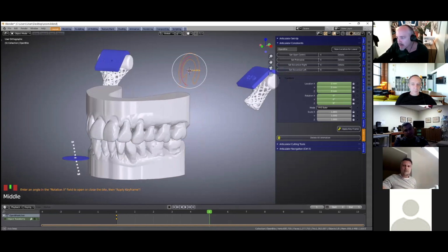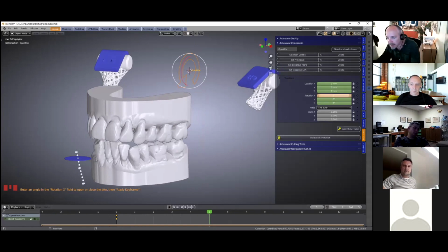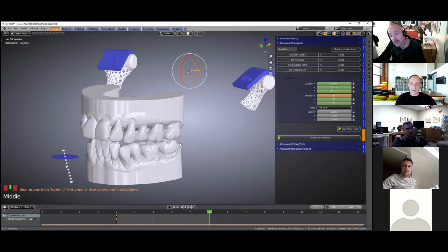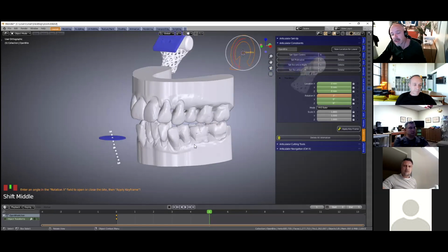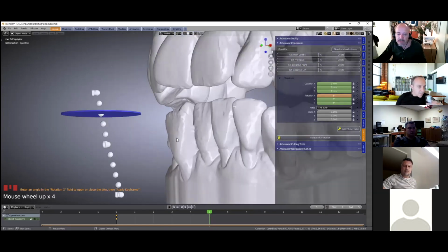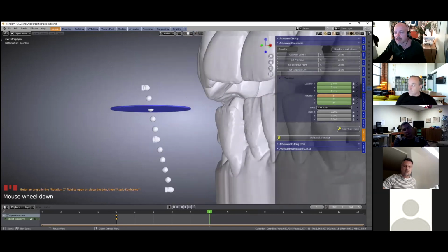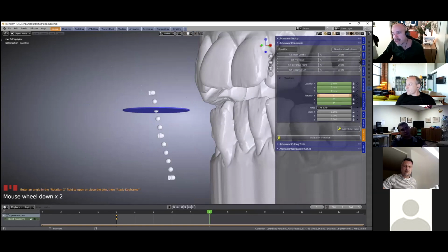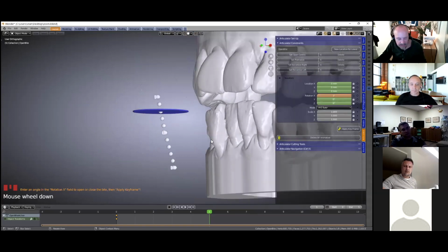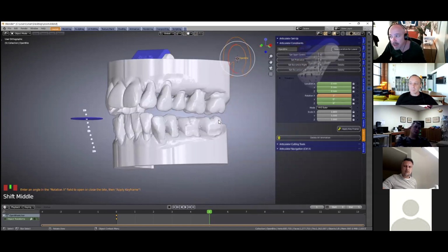So here we're going to set this to, say, 3 millimeters on the X. Oh, it's measured in degrees, isn't it, Michael? Degrees. Yeah, degrees. And that's opened it now at 6 millimeters: 0, 2, 4, and 6. So it's times 2. 3 degrees times 2 would be 6 millimeters. It's actually quite amazing how that works. That's also on an articulator. So if you'd open it up that.